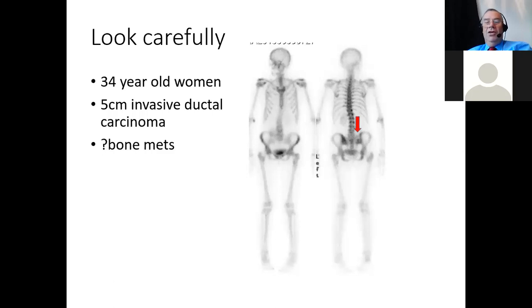Thank you. You can see that there is a defect in that sacroiliac joint, and that's a lytic metastasis. So lytic metastasis is a lot more difficult to see than positive ones. If you look at this one, now I'm taking the arrow away, you can see it very clearly, but you may not have been able to see it so clearly without an arrow.